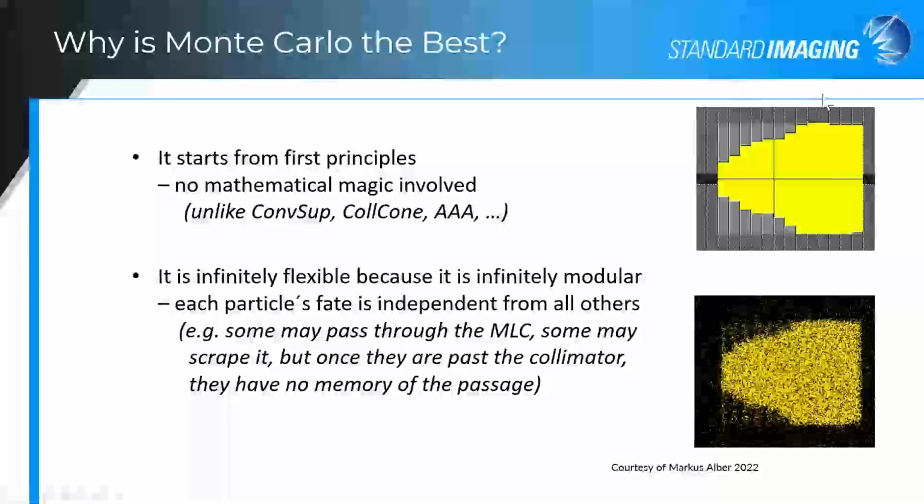What is shown here is your aperture, and of course your Monte Carlo dose deposition of what occurs through these leaves and, of course, in the opening. Things to notice are the gaps in between the MLC leaves, which you can see here as well. And of course, your backup jaws, and you can of course see the difference in transmission.